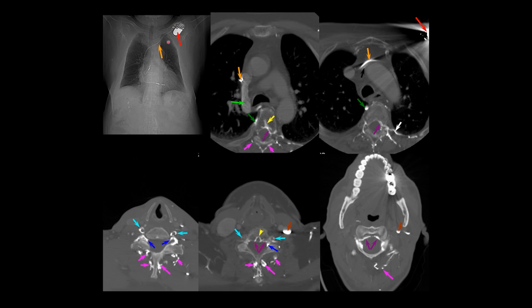In this case, for example, the reason for the reflux is that there was thrombosis or occlusion of the left subclavian vein, so the flow goes all the way up to the jugular vein and finds collateral ways through the other veins in the neck, and this will opacify all the extrinsic system. Again, it's not a vascular malformation, but it is a good example to understand well how the epidural channels are connected with the external system.